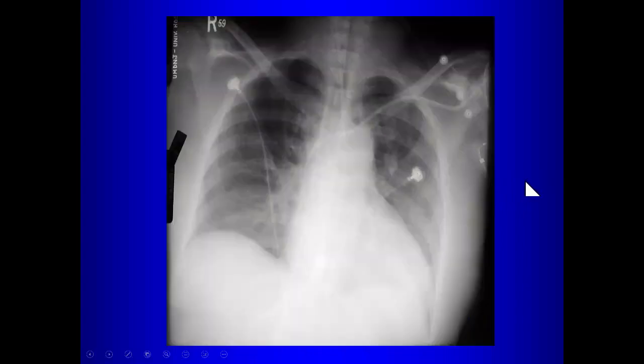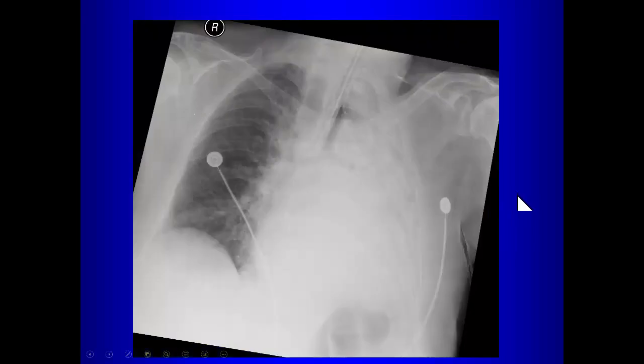Well, you don't have to go that far, just suctioning. So if you do some suctioning, suck out the mucus plug, and the lung can expand pretty quickly, okay? So you want to be able to differentiate pleural effusion from mucus plugging. You look at what's happening to the mediastinum, because obviously you're going to treat them very differently. Here's another patient with whiteout. What's the cause of the whiteout in this case?